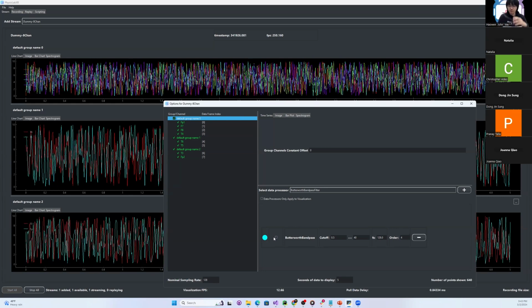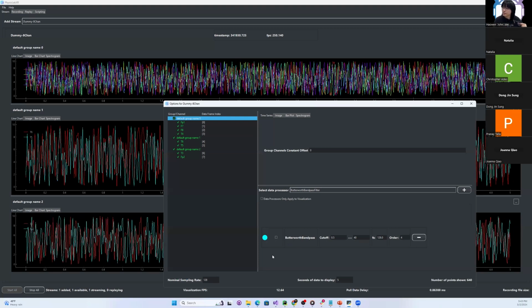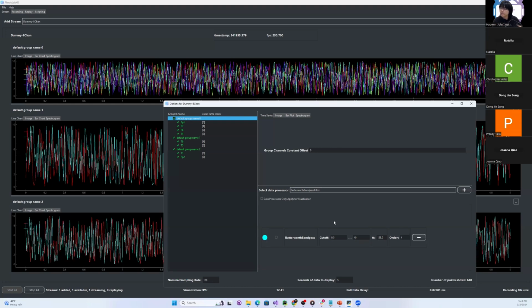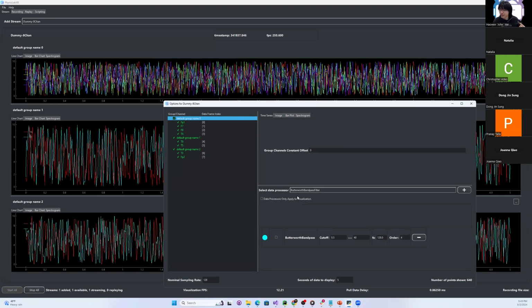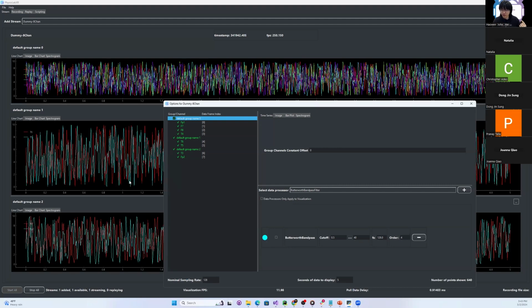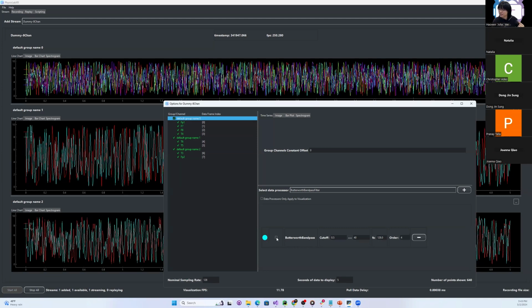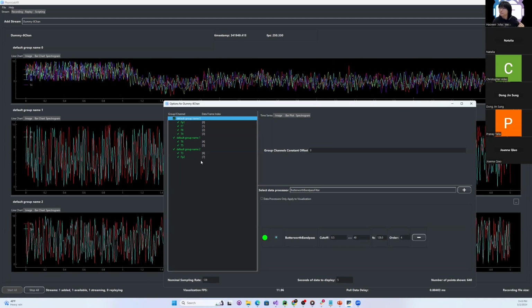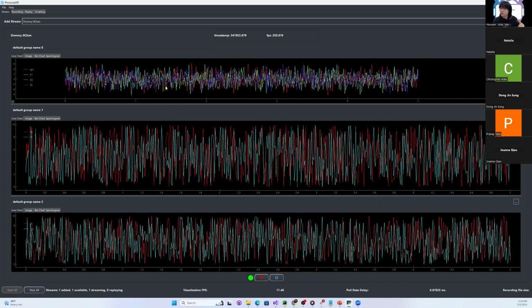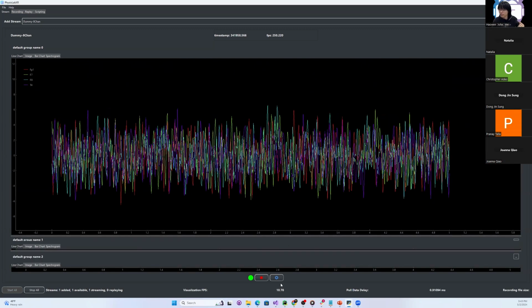So for example, this is a Unicorn device you will use in the hackathon. Before you do any further signal processing or analysis, make sure you have the notch filter and Butterworth bandpass filter on all your EEG channels. It's very important. Now if I activate the filter, you can see at this point I only kept the signal frequency between 0.5 and 40.